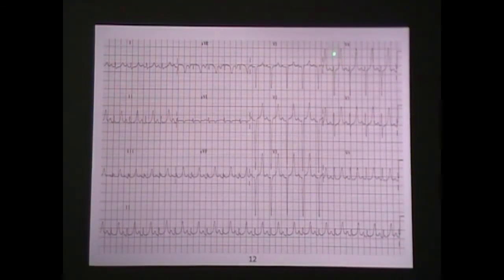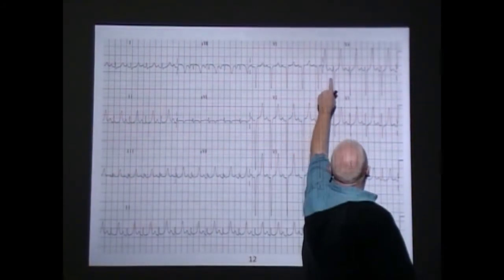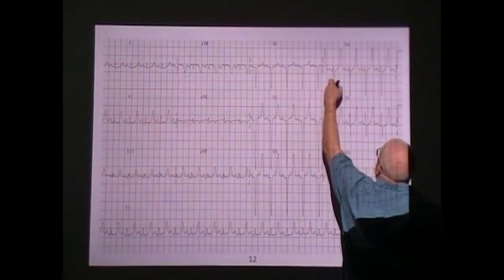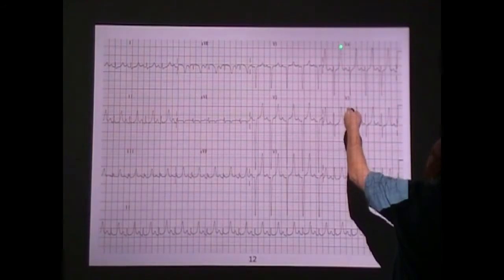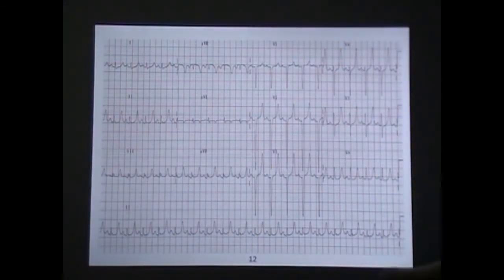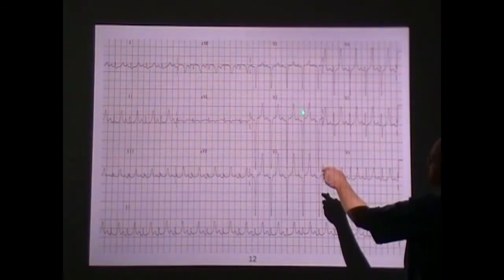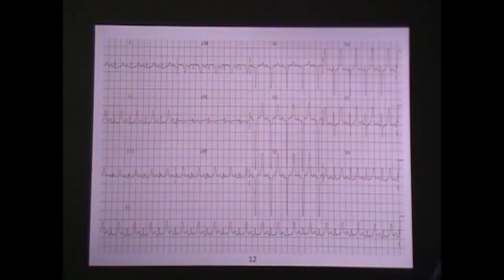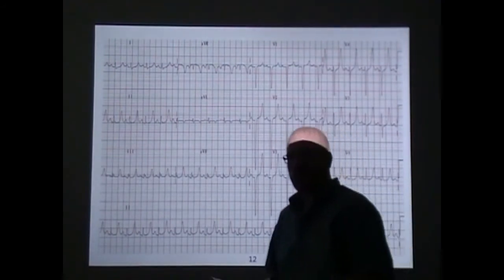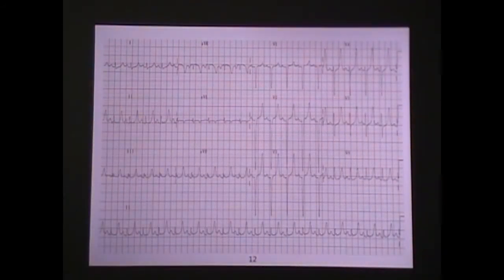See this right here? I think that's probably an S wave. It's not flipped. I've got a positive QRS right here, and then these big peaked, pointed T waves in the precordial leads. I'd be looking for a clinical picture of, does this person likely have high potassium?